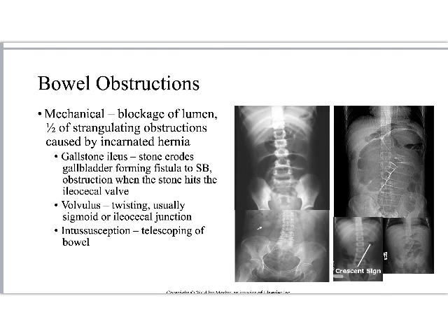So if you notice here on this KUB, tons of air. This is actually a CT topogram. And look, we didn't even need to do the rest of the scan. We've already diagnosed obstruction. And this is crazy how much obstruction there is there. Now, if it is an intussusception, two common signs are the crescent sign, where it's crescent shaped. No part of the bowel should be crescent shaped, right? We should see tubes running every which way. We shouldn't see crescents. If you see crescents, something's wrong with the tubes, right? Or you might just see this coiling up of stuff.